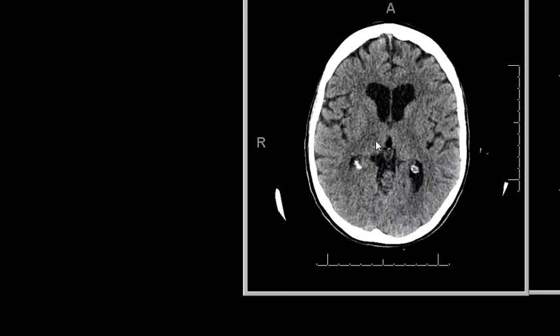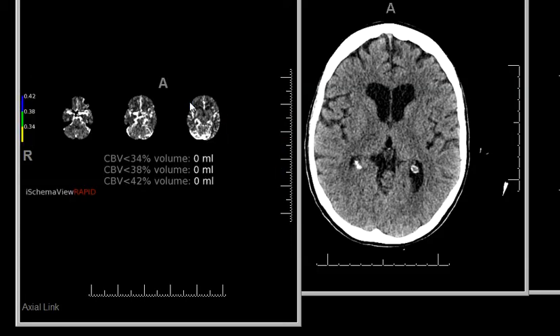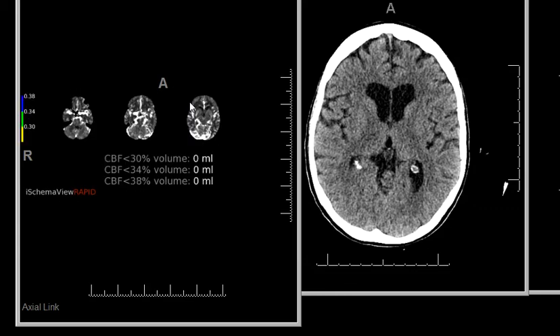It's hard to tell on CT, and difficult to determine. Perfusion didn't show anything.